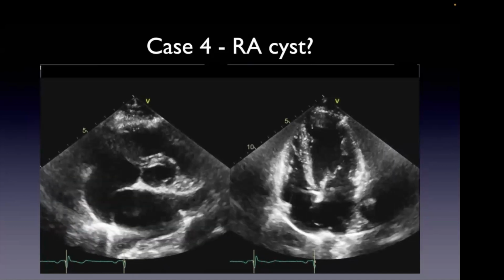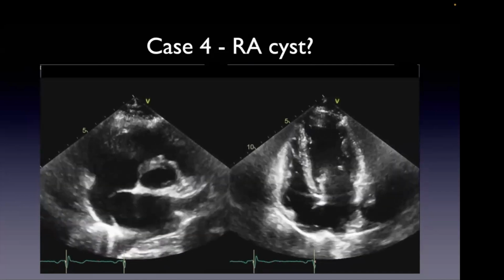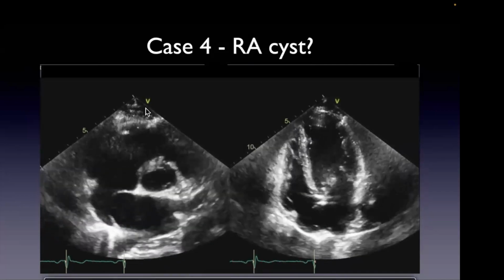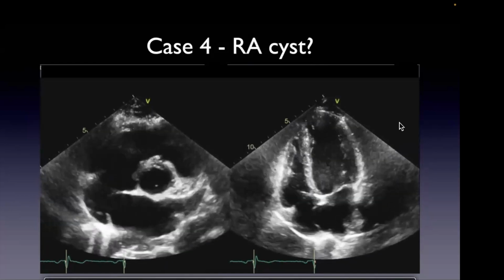So we'll see that occasionally on the first view of it, in the RV inflow view. So it's just en face. With the RV inflow view, you're cutting it essentially through here, and all you're seeing is this round portion coming up here. Okay? How do I find these?